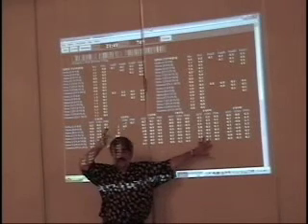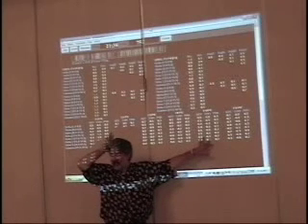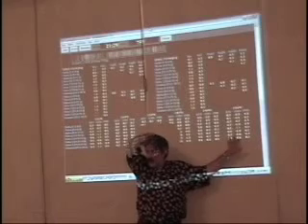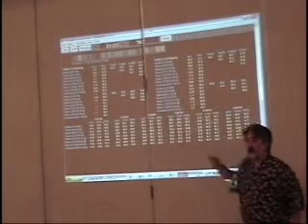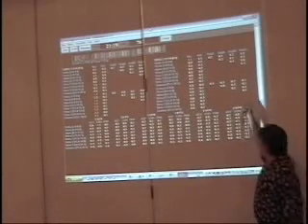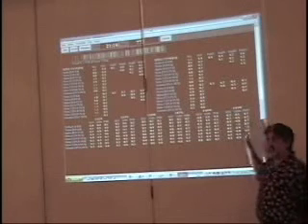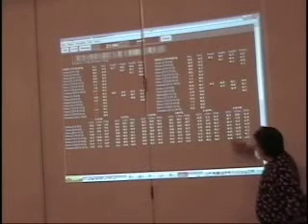This section is F4 to P4. That gives us the right intrahemispheric connectivity. Finally, we have P3 to P4, which is the posterior interhemispheric connectivity. So this one protocol is monitoring 4 separate sites. For each site, we're getting 26 amplitude or power-based metrics monitored as z-scores. And for each of the 6 possible ways to connect them, we have 8, 8, and 8.